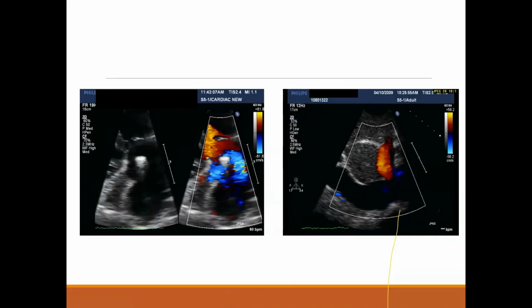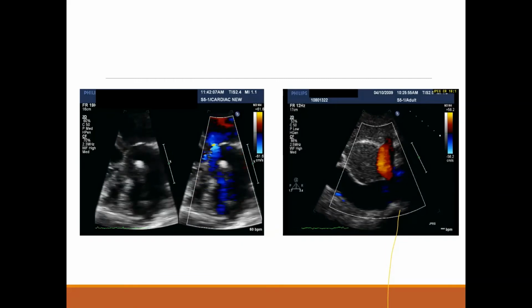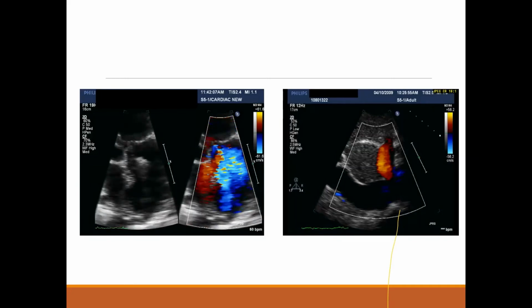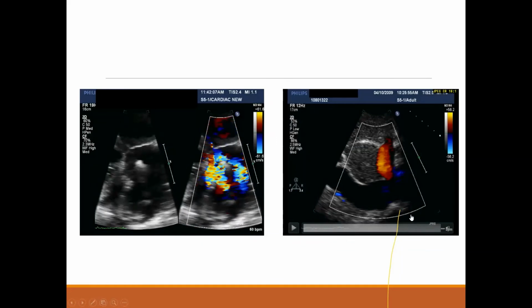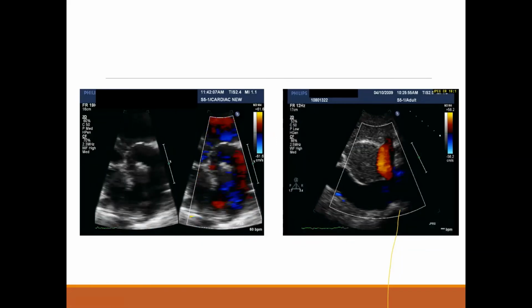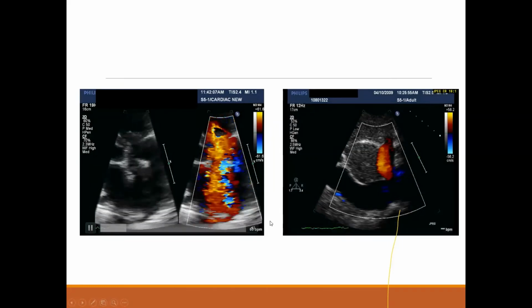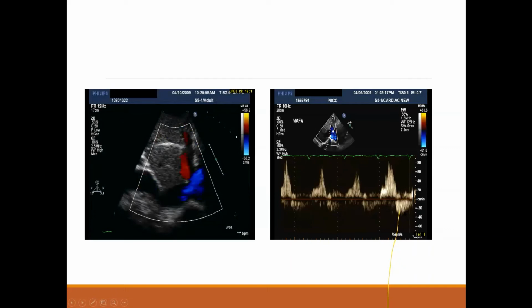Clinically, you are gonna find a pulsatile liver. So the clinical equivalence of reversal is pulsatile liver, and we know that pulsatile liver means severe TR. Okay, so whenever you find this one and you palpate the liver, you are likely to elicit a pulsatile liver. Okay, so this is important here. Now I'm going to give you the same in PW signal. You look at this one here.